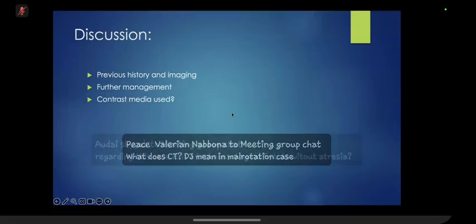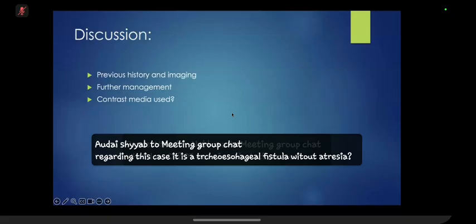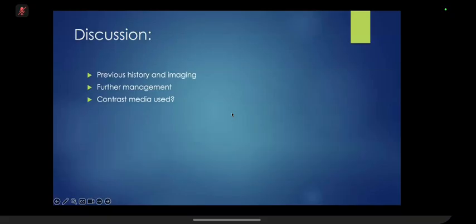Okay, about the stricture and fistula closure, yeah. So there was some kind of narrowing in the post-operative films, as we saw. But in the lateral views, it was very clear that the narrowing is opening up and it is leading to the continuous passage of contrast through the post-surgical tract. So it was not labeled as a stricture.